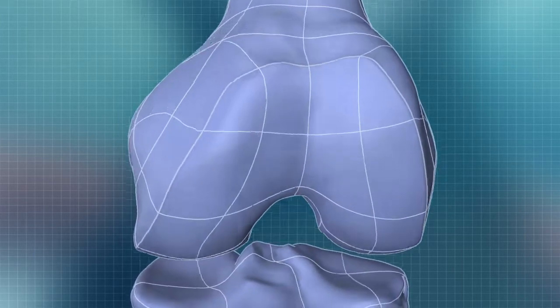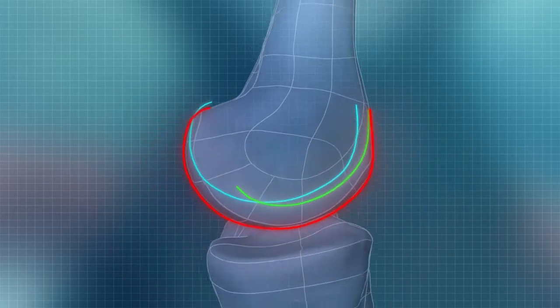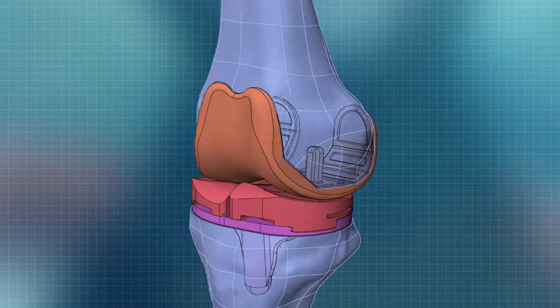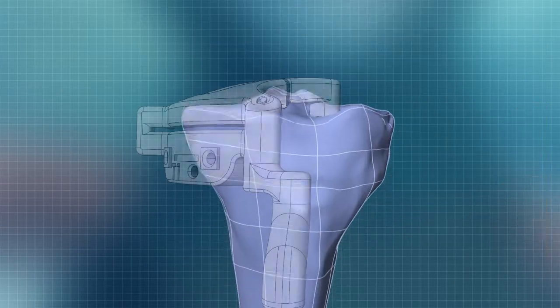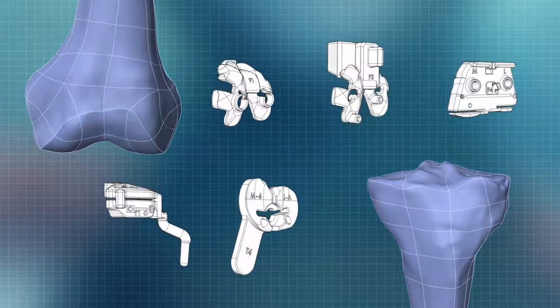From the 3D model of the patient's knee, iFit software builds the femoral and tibial implants to match the unique size and shape of each knee, which are designed to address common causes of patient dissatisfaction, including pain and unnatural feel. That same 3D model is also used to design patient-specific instrumentation for each step of the surgery, allowing for an efficient and simplified surgical technique.